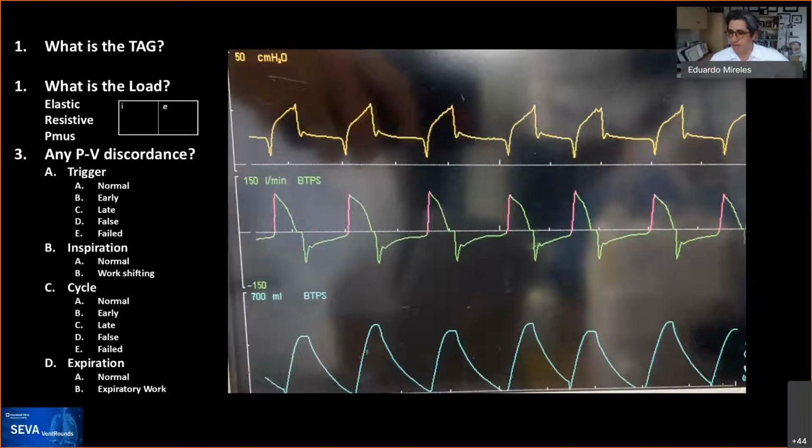Good job. All right, it will close in 20 seconds, and I will start reading it in absence of. I can do it. Okay, who's this? This is Aman. Aman. All right. Thank you, Aman. All right. So go for it, and then I'll show the results from our team.